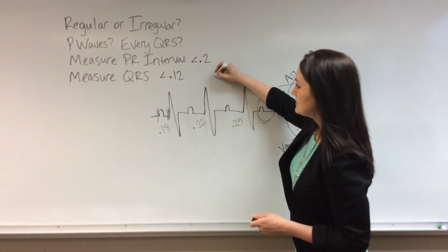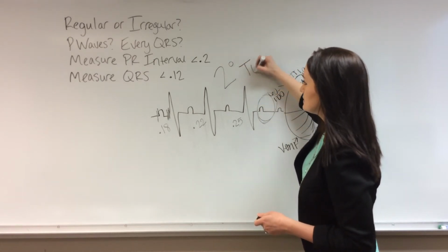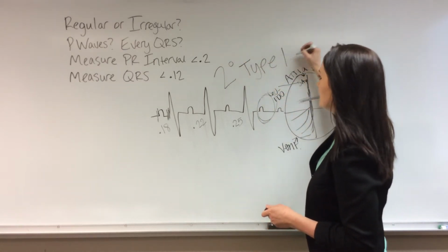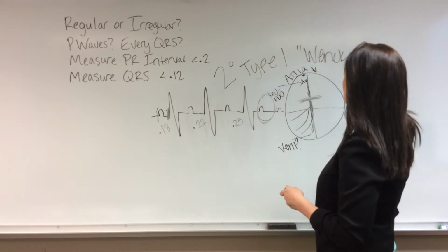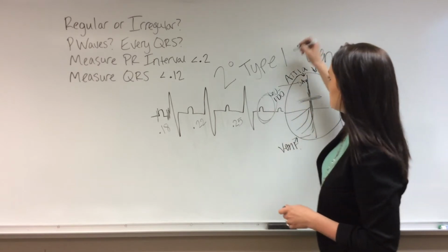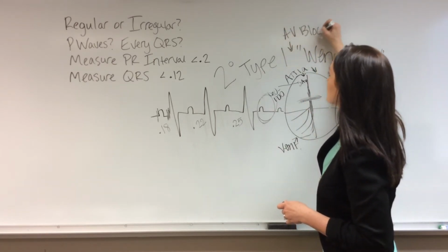So this is second degree type 1, or Wenckebach. Second degree type 1, oh, I should also include AV block.